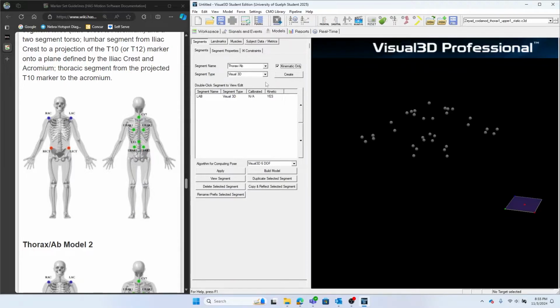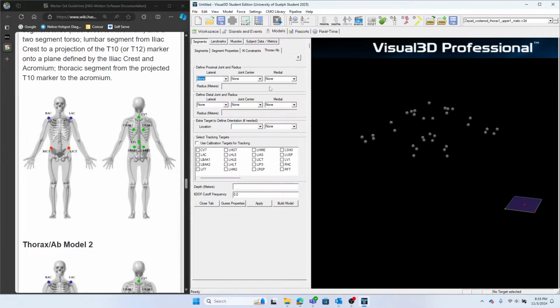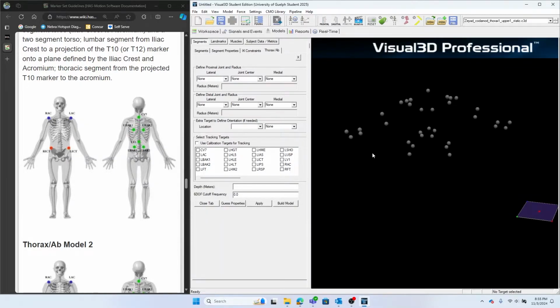All right, so after you've chosen this, click create, and next you'll be prompted with this, which has a lot of fields, but if you bear with me, we'll fill them slowly but surely, and we will be able to fill them properly according to the guidelines on the left.